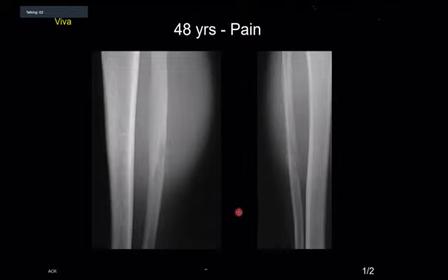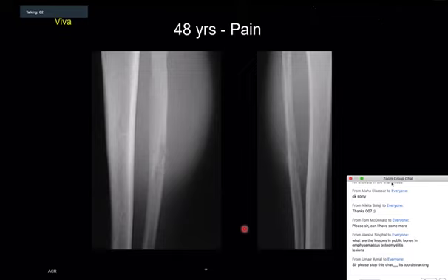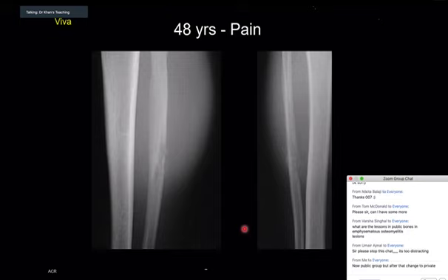Any aggressive lesion in the child, the top two should be infection, but with Ewing's, we wouldn't get that destruction, isn't it? No, Ewing's can. In Ewing's there can be a lot of destruction also, and the soft tissue component can be there. You can tell the examiner that because of these factors, Ewing is less likely, but you have to consider it, and then disregard it. So that's a bit of fine touch.